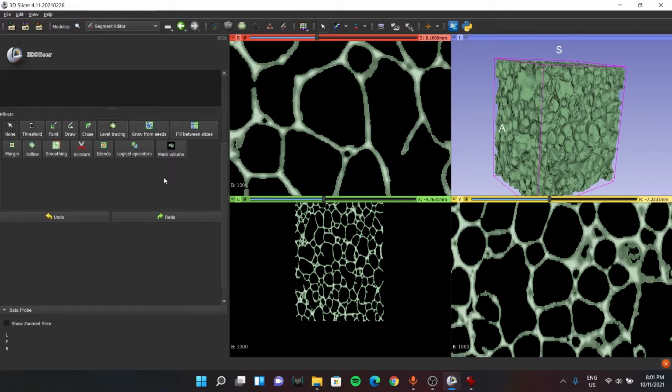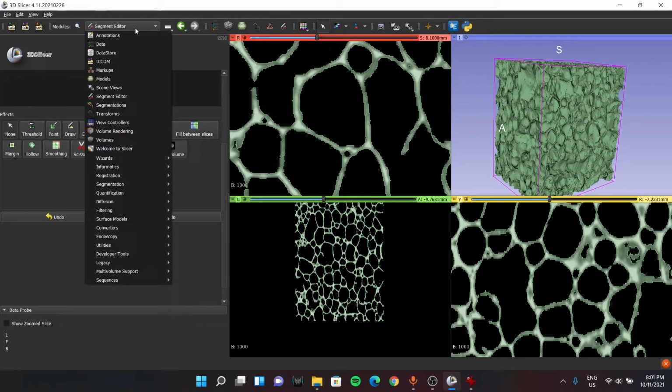So now we'll export, but here there's one important factor we should be considering right now, which is the file size. So normally the STL file formats of regular SolidWorks design would be about 1 MB at max, but if you export this data directly, the file size is going to be pretty huge, about 1 to 2 gigabytes. So we don't want that amount of memory to be consumed, because it'll complicate the computational part during the analysis. So for that, we need to reduce the file size. So how can we do it?